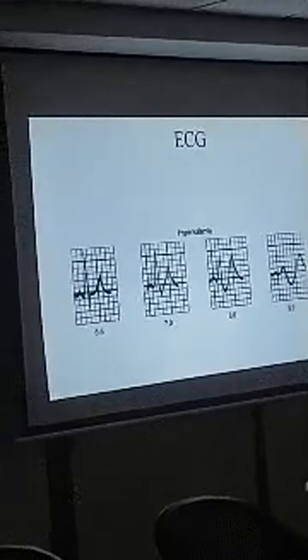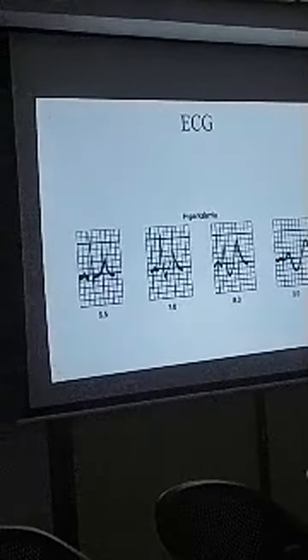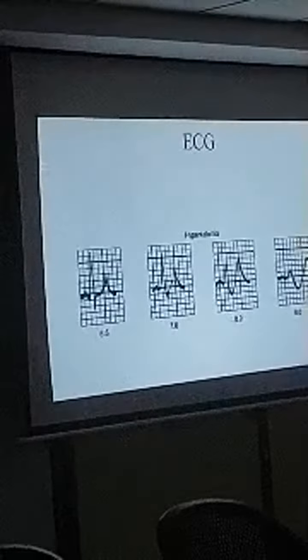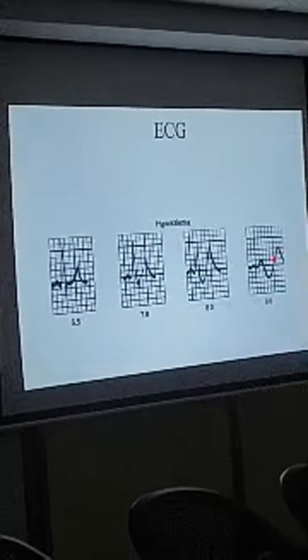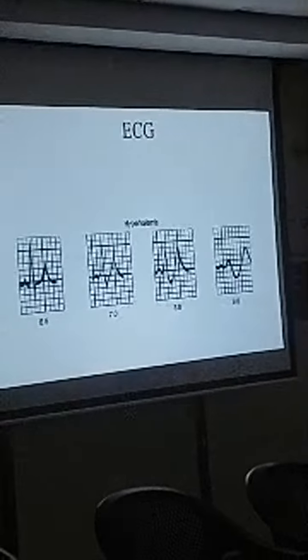His creatinine was 4.5, potassium was 7.1. It's a muscle injury, so CPK was elevated. So this is how your potassium level will cause changes. As your potassium level goes up, you will see changes in the ECG. A lot of times people say you may be able to tell potassium levels just by looking at the ECG, although it's not always true. But most of the time, seeing that ECG, you know potassium is more than 7.5, and the patient is moving towards what we call a sine wave. When the potassium crosses 8 plus, you will see a sine wave pattern, and the patient is going to arrest if you do not correct the potassium soon.